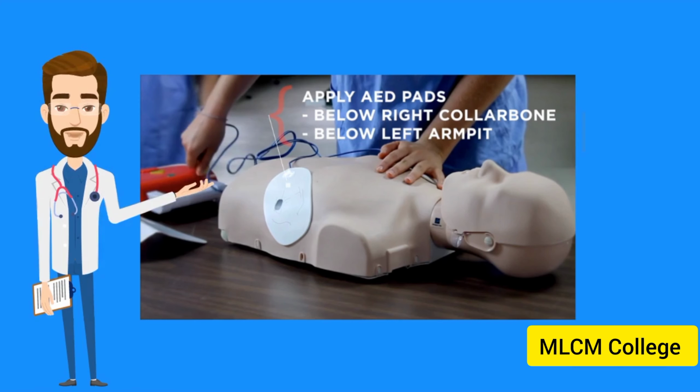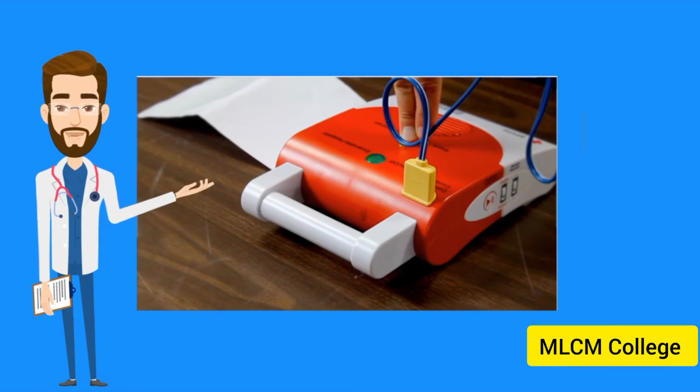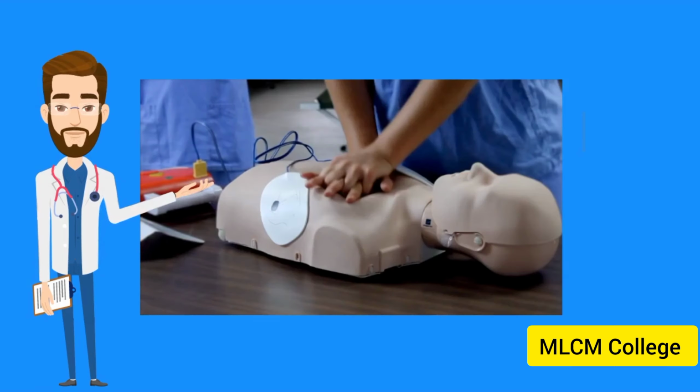If no shock is advised, resume CPR beginning with chest compressions. If shock is advised, clear the victim again before delivering the shock. Once the AED has charged, hit the shock button.